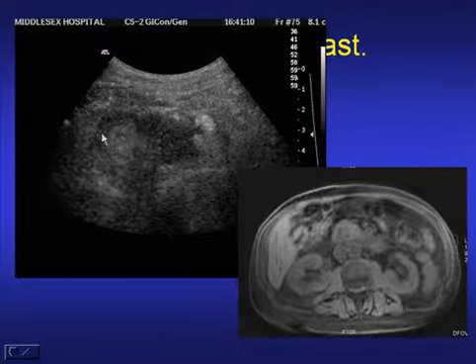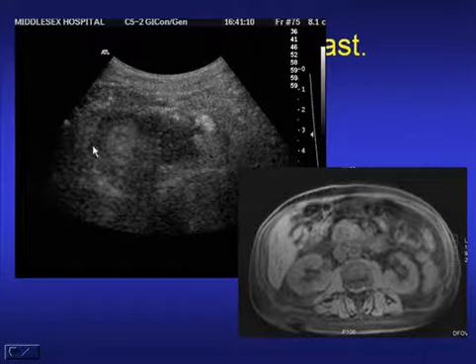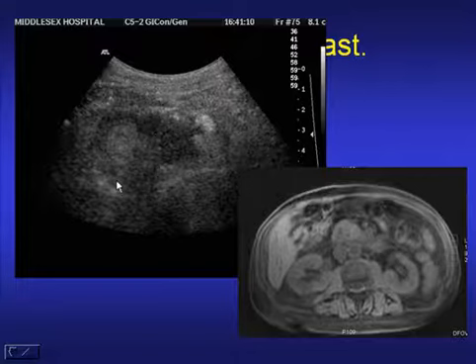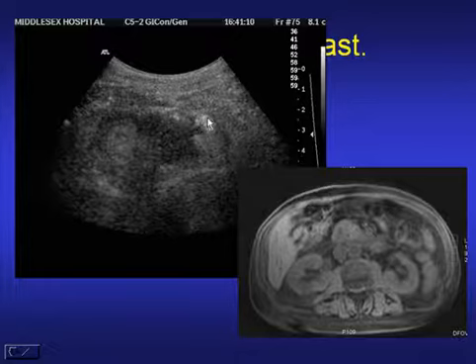This is the mucosa of the duodenum. You can see the layered pattern, which is enhanced normally. And this is poorly enhancing tumour invading the muscularis propria of the duodenum in almost a circumferential pattern. So we're seeing that really well, both anteriorly and posterior to the tumour. But here's the key finding on this scan. We can see a tiny tongue of tumour here growing out towards the enhancing superior mesenteric vein.